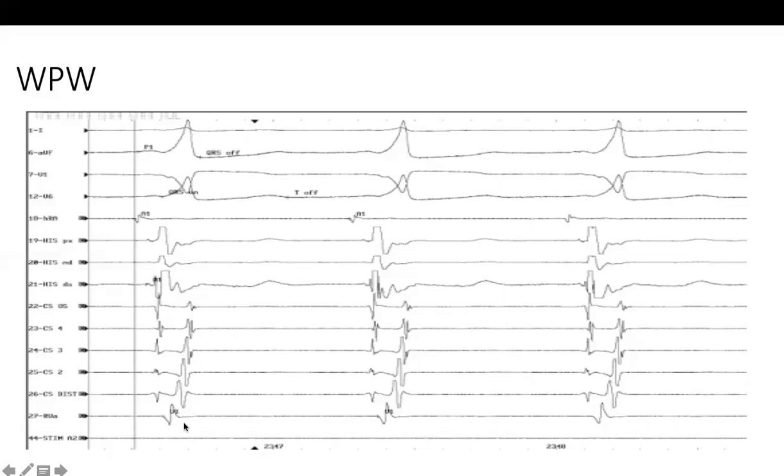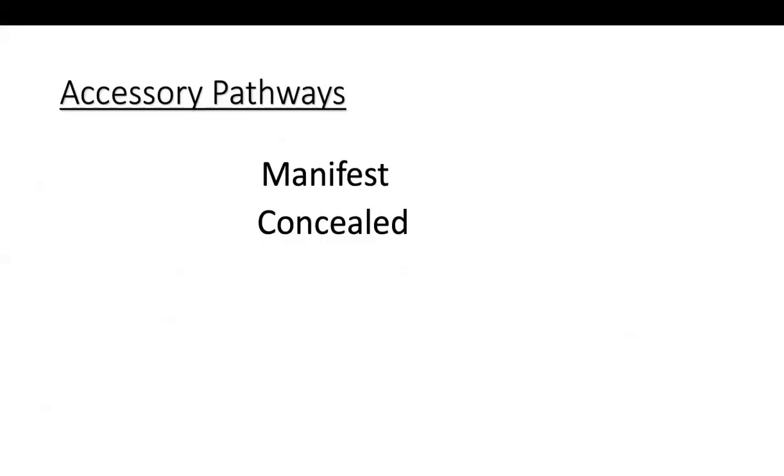I applied the concept of the AP lab, where we measure the earliest point. But we put a line, and our reference is the line. You just draw a line and see which one is the earliest. Roughly might help, but might make you a little confused.